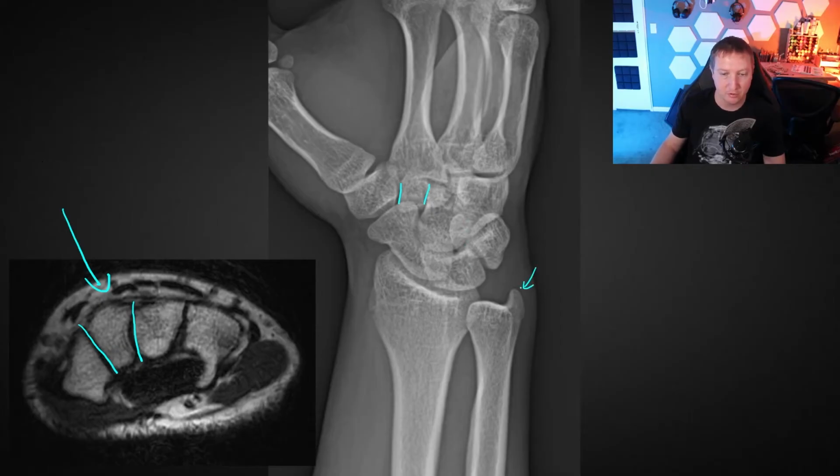Gives us a better look at the ulnar styloid in some cases. And so this is a very helpful view, for a number of different reasons, just to give us a slightly different perspective on things. And even the base of the thumb here, we can see a bit better as well, perhaps. Oh, and look at this. We can actually see that little overhang at the physeal margin here. So very common to see that.